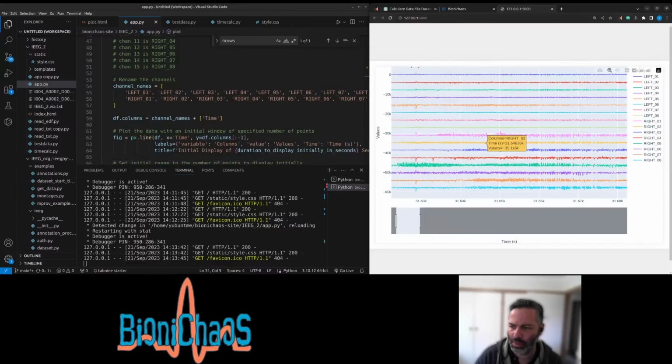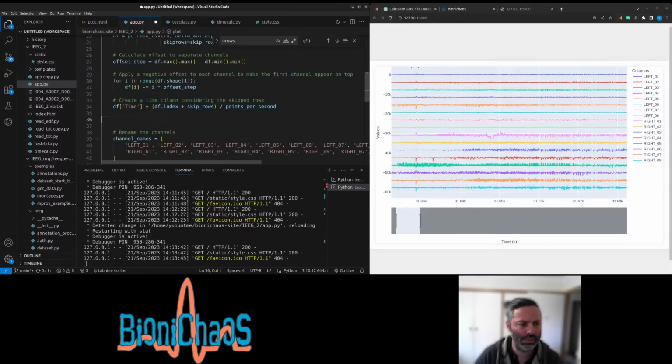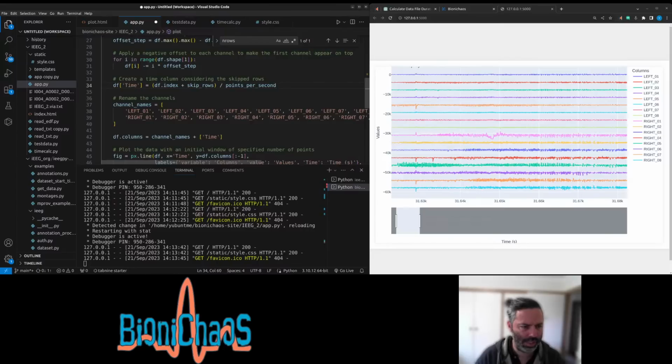I want to make some improvements, well, quite a lot of improvements. So we don't need this because we have the names there.